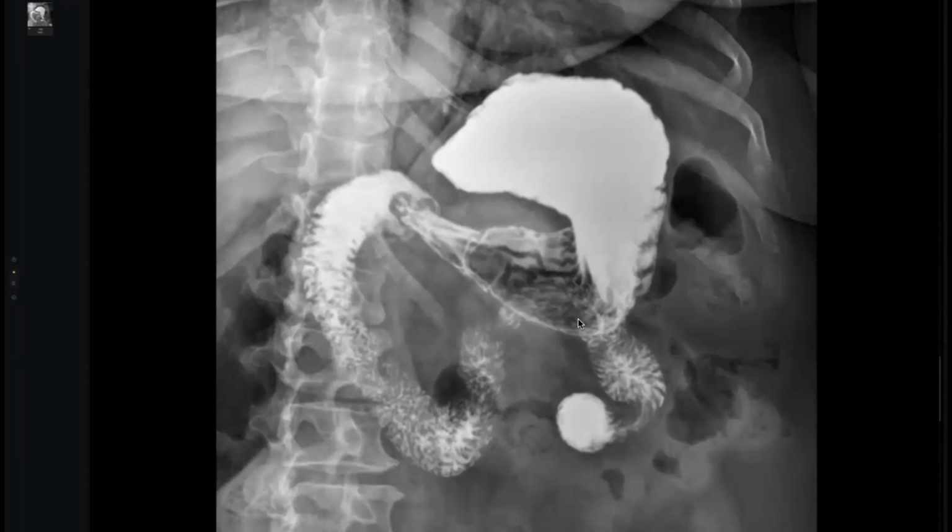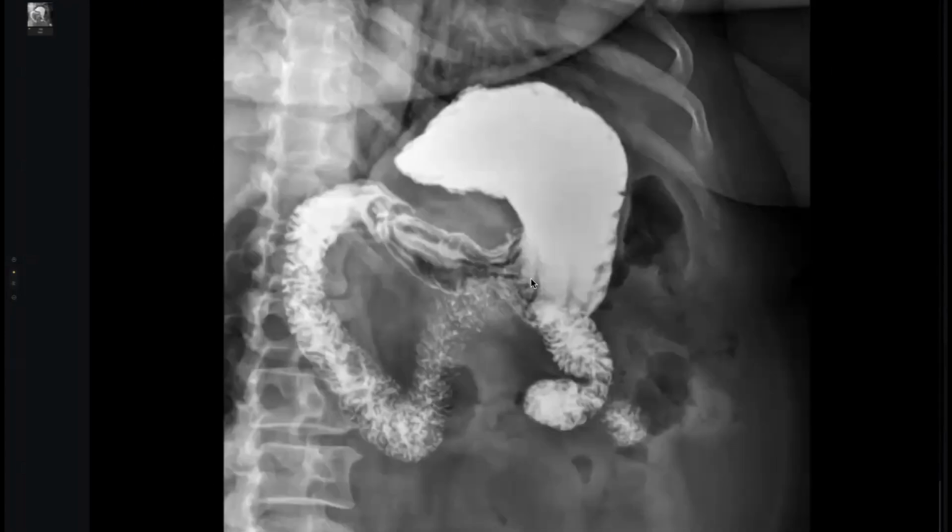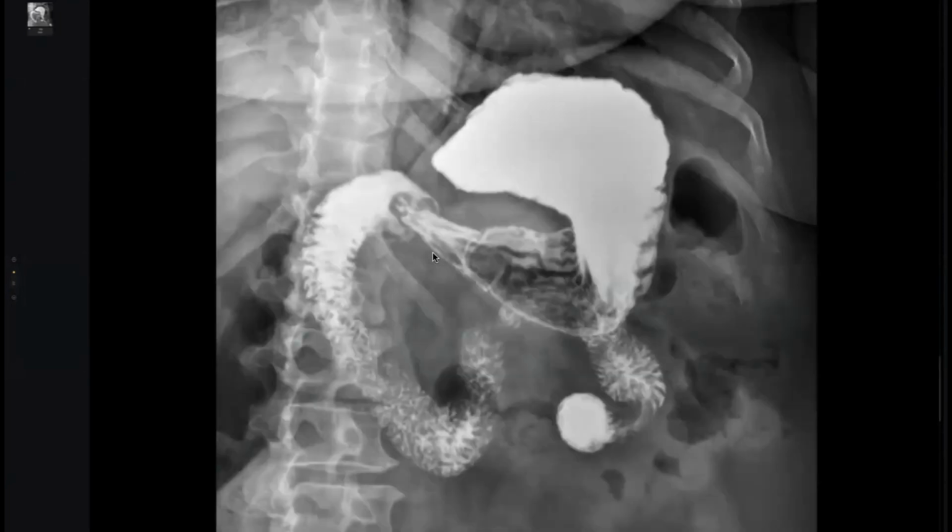Thickening of the gastric rugae. This is the normal. See, this is the normal. Why? Like this, like this, all are uniform. So this is the normal. We should even wait for filling of the stomach, but anyway, this is the normal. What else? You are very near to the answer, by the way.